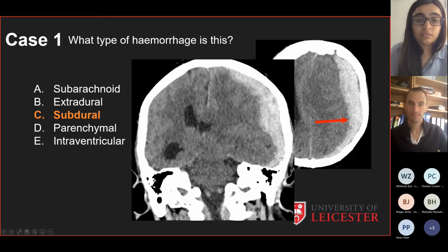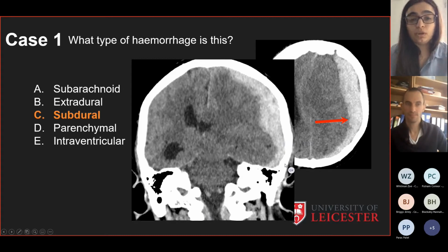Sometimes you can get subdurals which are quite small and the only finding will be a subdural collection, but there are other times when that subdural will cause a lot of effacement and mass effect on your surrounding structures, and that's what you've got to be really careful about.